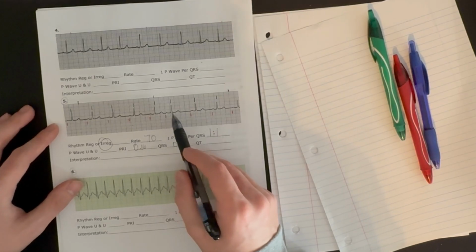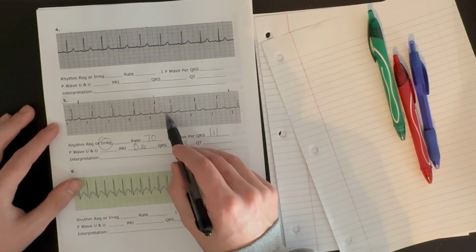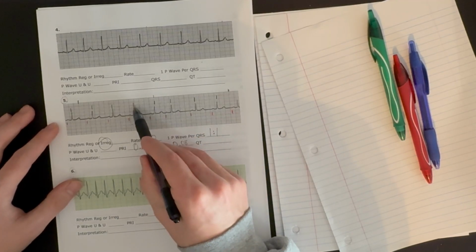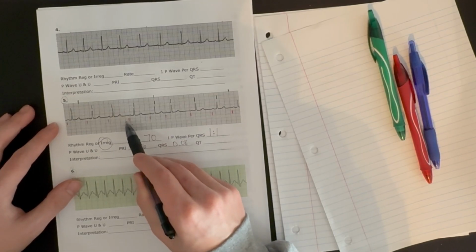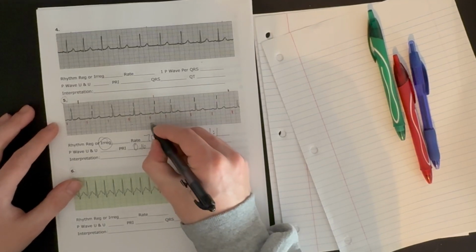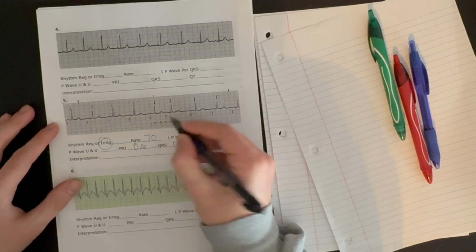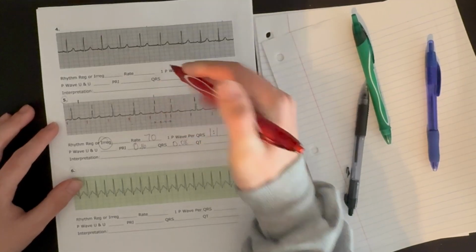Look at the timing between, and all of a sudden it got shorter. What happened? We have an extra heartbeat that came before when we would expect the next heartbeat to come, because it should have been about right here, right? If you look at the P waves, these heartbeats start about 1, 2, 3, a half, about 4 apart. So if we count from the start of this P wave, this last normal beat, we go 1, 2, 3, 4. If this was a normal beat, it should have started right here.